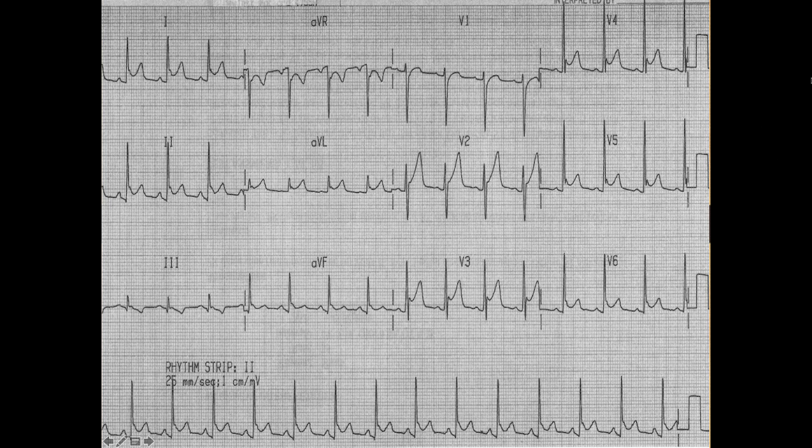So we have ST segment elevation everywhere. So if we think everywhere, we're thinking either benign early repolarization or number 2, pericarditis. Patient presentation, patient history is going to tell us which way to go on that one 99% of the time. But even just looking at this static 12 lead, I don't know anything about this patient's history other than it was a confirmed pericarditis.